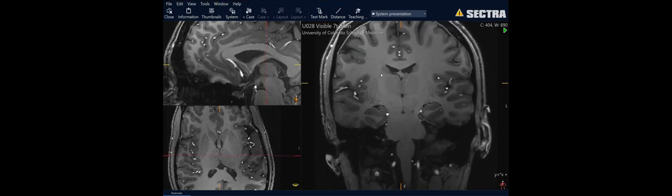Caudate thinning out. You can see those small cellular bridges even in the posterior limb of the internal capsule. At this level, we'd have the substantia nigra and subthalamic nucleus immediately above it.